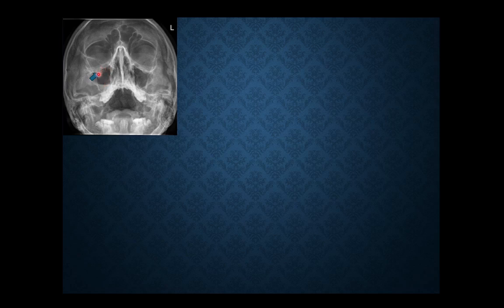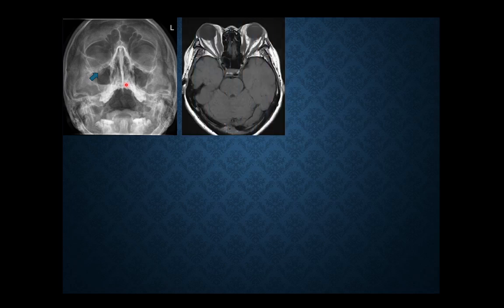Okay, this is on the inferior orbital margin. Blowout fracture. It's a typical teardrop appearance. So somebody is just crying from one eye, unless it's a double blowout fracture.